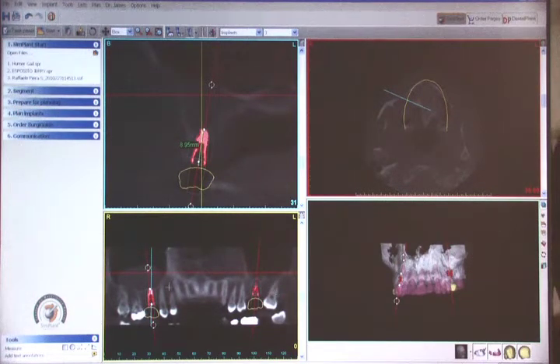Okay, and again, this is a good view to show how there's your mucocele, or potential mucocele, and then you can see over here the thickening of the membrane on the patient's left side. Okay, we'll go from there. Let's start with number 3, and Tim, let you take it from there as far as what you want to do with this. Right now we had left it just short of the sinus, or a little bit into the sinus, and you can give us your 2 cents on how you would treat this case.